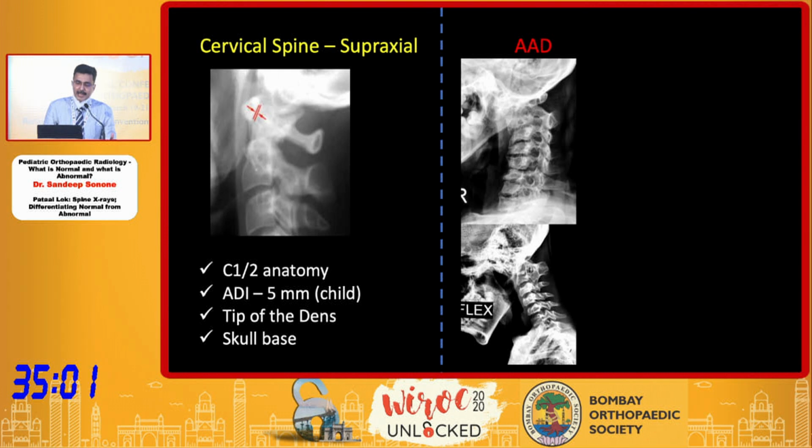Here are some of the abnormalities in which all these parameters are disturbed. The C1, C2 anatomy is disturbed.